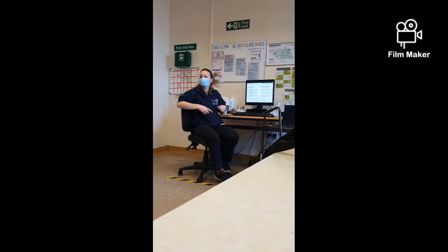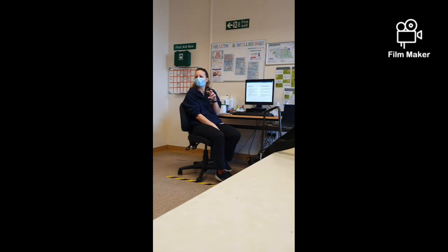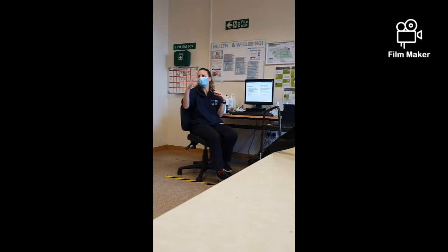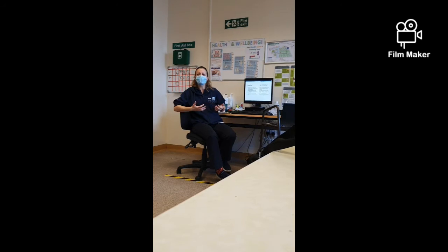Okay. And then your D is your diaphragm. Each hemidiaphragm should be dome shaped, and they should be pretty much level. The right is literally 1 or 2 centimetres higher. Does anyone know why the right side of the hemidiaphragm is higher? Yeah, excellent. The liver pushes it up. So it's making sure that one's not excessively higher than the other. Also, sometimes they can show higher if they've got a bowel obstruction or a distended abdomen. That can also push up on your diaphragm, so it's just to consider that.